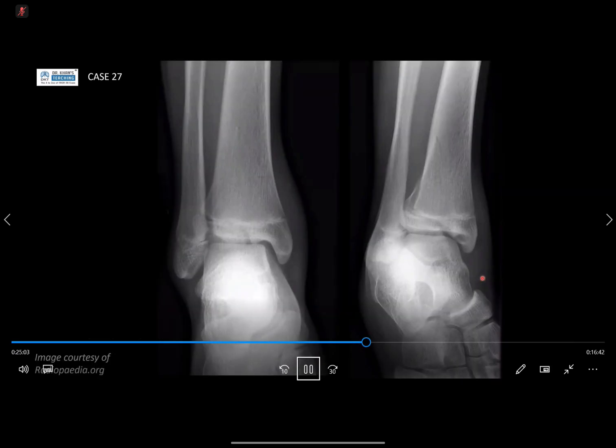So I'm not going to let you go through this case because I think I've already mentioned it earlier. This is the other slightly more extreme version where you've got that nice line through, and then through the opening of the lateral unfused physis, you can say, central is definitely closed, medial may be closing because there's a bit of lucencies here and a bit more continuity here, and this opened, and then when you see on a slightly rotated view, you can see the fracture going up here.